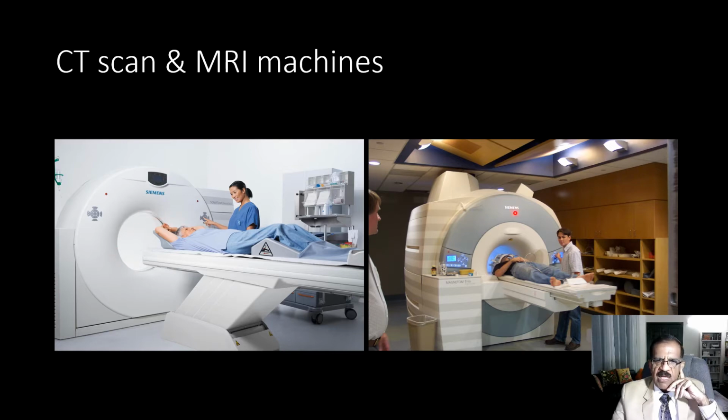This is the magnet part, and I'll explain the basic physics, but of course not in detail. So these two are very similar looking machines.